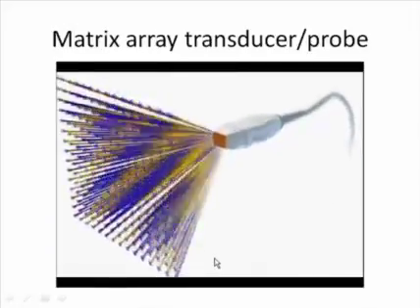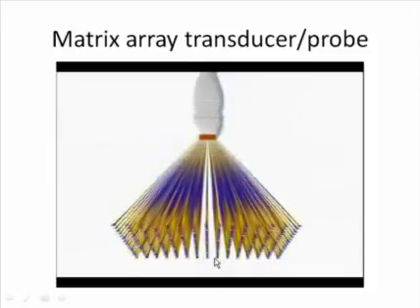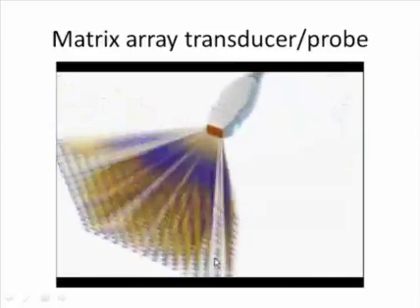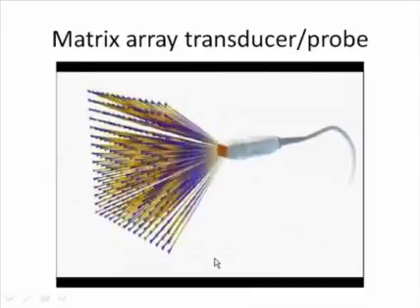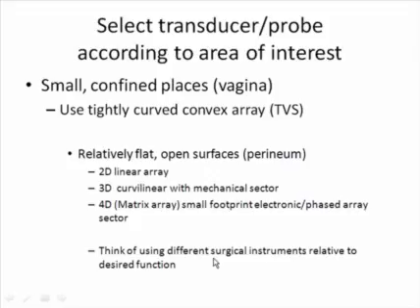The newer matrix array probe design is shown in this animation, where there are send-receive elements, and the 3D volume can be interrogated in real time in any particular plane. These are very exciting potential applications in this area.